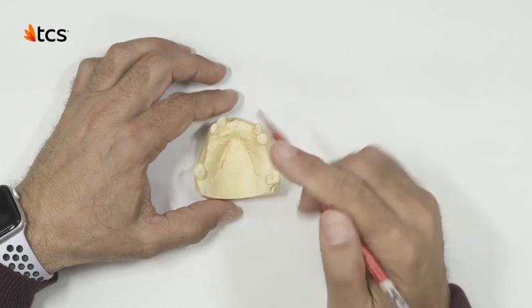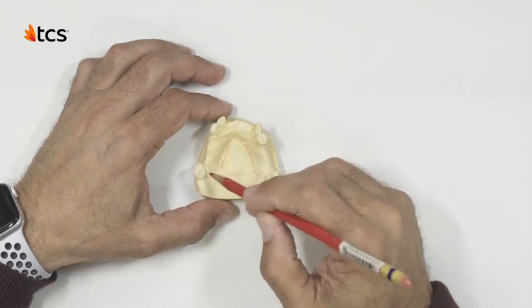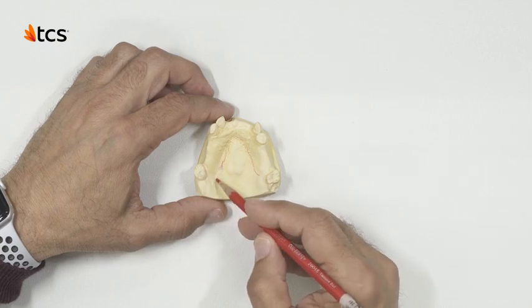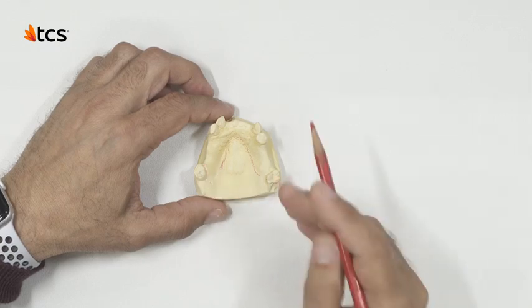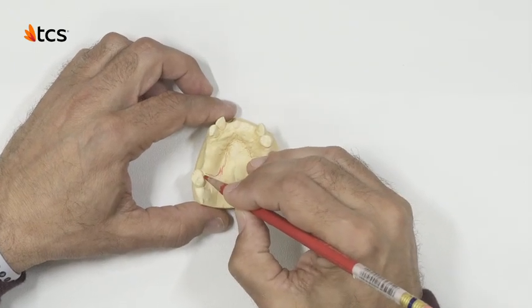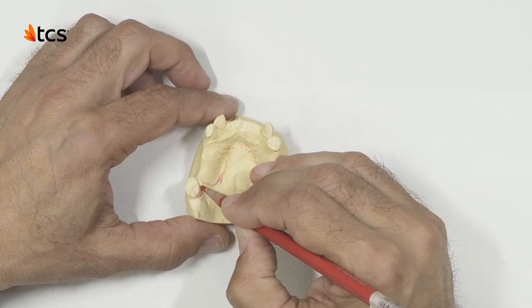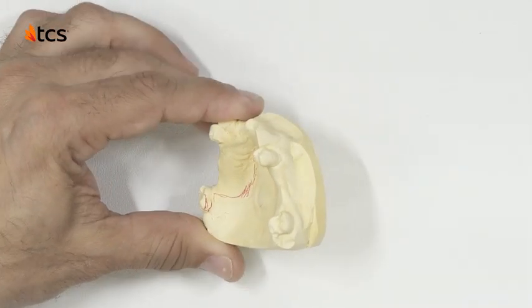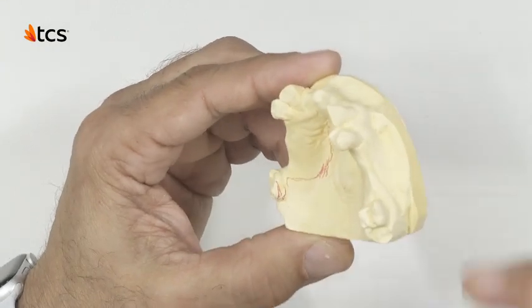As for the lingual design, we have two options. One is to plate it using surrounding tissue. The second option is to use a finger clasp design. This option will use less material and will be more comfortable for the patient, especially under mastication.